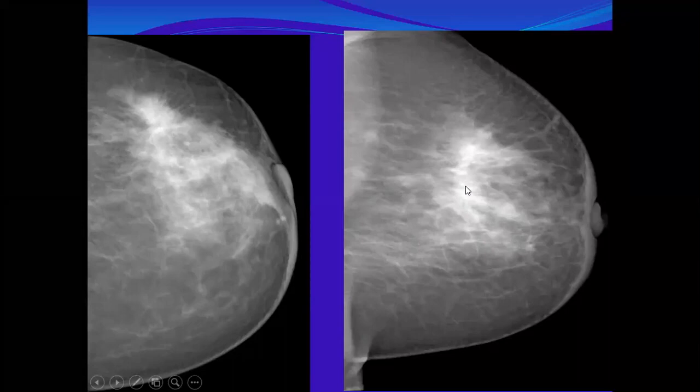But multifocal asymmetry, okay, associated with distortion and diffuse breast edema and skin edema, more around the areolar skin, with nipple retraction. So I'll go for BI-RADS 5. I'll go for BI-RADS 5, obviously. So these are associated features.